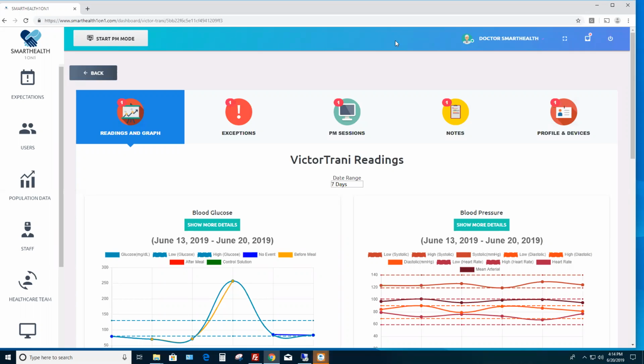Thank you for joining me on this brief system overview. Smart Health One-on-One is a remote home patient monitoring platform designed for the management of chronic conditions. The user interface we're about to explore contains information in regards to patient monitoring.